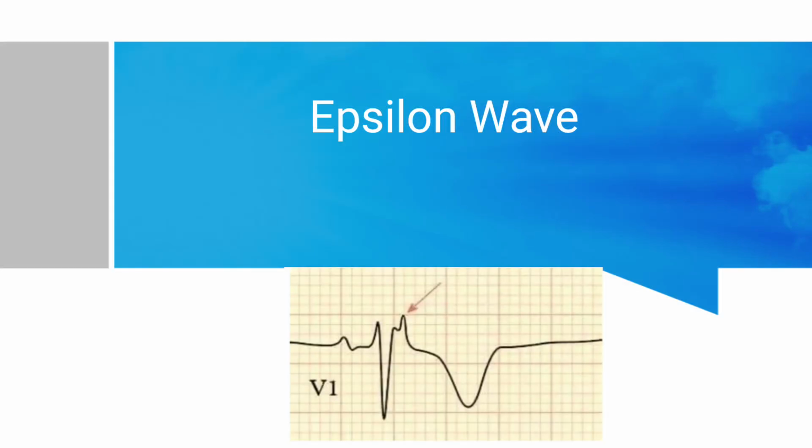In this series of ECG Basics, today I will talk about Epsilon wave.